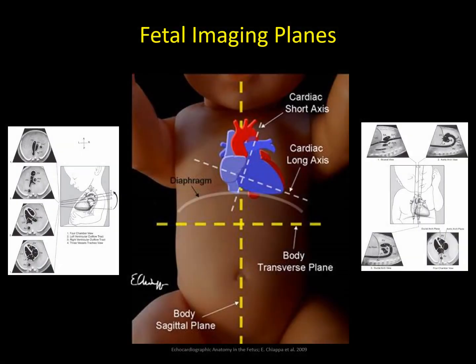It's important for me to emphasize that the sagittal fetal body plane and the transverse fetal body plane do not line directly up with the cardiac short axis and cardiac long axis planes of the heart.